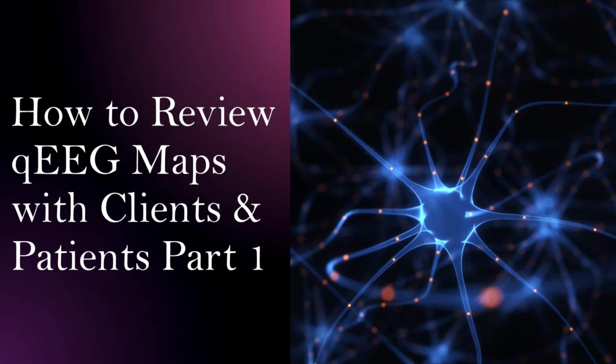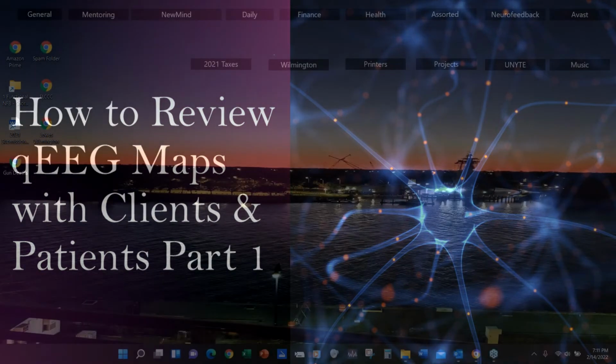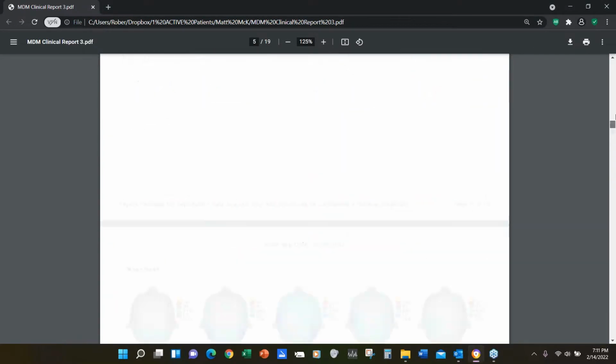So join in. And I have a map I can put up at any point in time, for us to work with as a working model. I've got one that we can just pop up, a pretty typical looking map. Excellent. I'll just turn the screen over to you, Rob. Okay. All righty. We can all focus on the same page. And here is the map. I'm going to blow it up a little bit here.